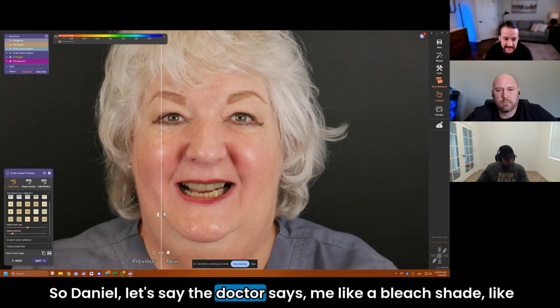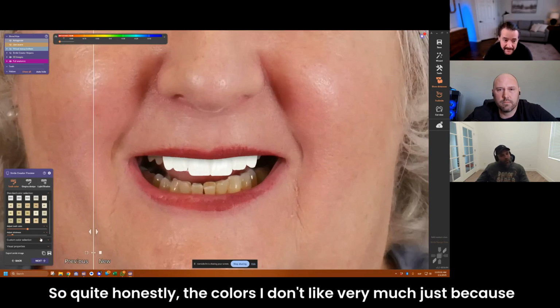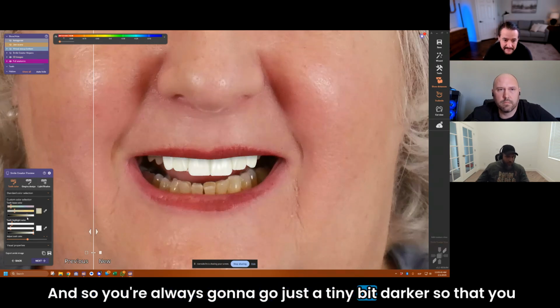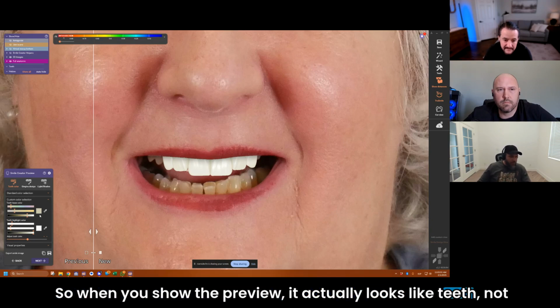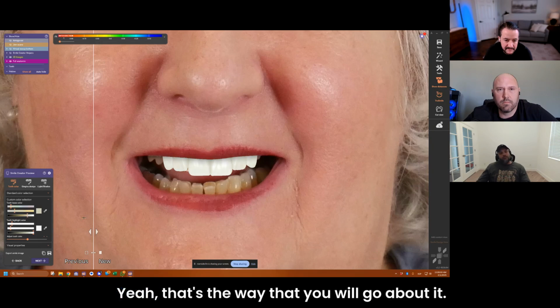So Daniel, let's say the doctor says, give me a bleach shade, like a BL1. How close can you get that here? Quite honestly, I don't like those colors very much, because if you give them a real bleach shade, it just looks like this, right? So you're always going to go just a tiny bit darker so that you can see all the details. When you show the preview, it actually looks like teeth, not like you cut out the picture with a white background. Right. And so, yeah, that's the way that you will go about it.